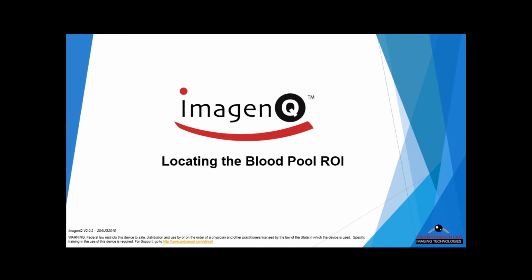This educational video will demonstrate how to identify the correct blood pool region of interest for absolute quantitation using the ImagenQ version 2.0.2 software. Correct identification of the blood pool region of interest is the most important step in making reliable and accurate measurements using ImagenQ.